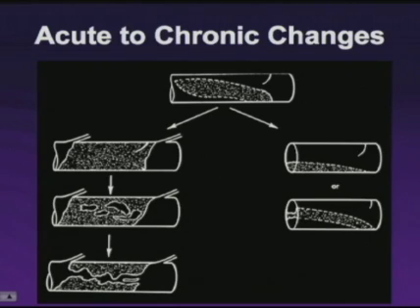On the right we can see the effect of retraction, where part of the wall is separated and it gets closer and closer to one remaining wall. And then a third part of retraction where it actually separates from both ends of the wall, leaving a narrow band of tissue or fibrosis in the middle, a so-called web-like change or synechia. And we can see any or all of these in patients who have chronic venous change.